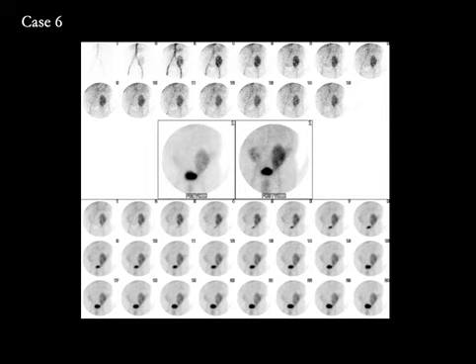For any kind of rejection, remember that the blood flow needs to be compromised. So as long as you see normal blood flow, there is no evidence of rejection.